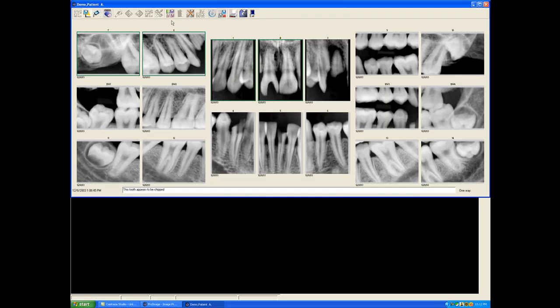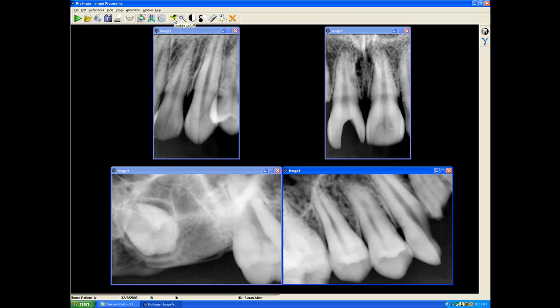So I'm going to select 4 images again and load them. And here we have the spotlight. When I turn the spotlight on, I come down to the active image, which is this one here with the blue bar. This is great. This pops out. It's an exaggerated auto contrast. It's a bit noisy, but it is temporary. It's not permanent. Like that one a lot.